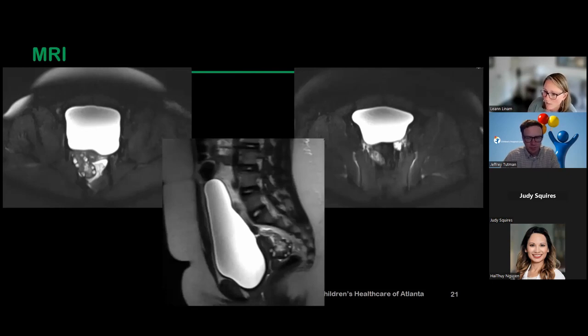We would have a hard time getting a patient in at our institution. But again, the findings are similar. There's an enlarged ovary, peripheral follicles displaced into an abnormal location. And you can see the twist right here and right here.